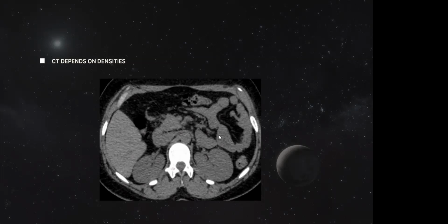Once a friend of mine asked, is CT better than MRI? The answer is CT is not better, CT is more feasible, it's more readily available, and in certain conditions, it does the job you need it to do. You don't need to go for an MRI to see any intraparenchymal hemorrhage when the patient has presented to you in the emergency and you really need to take an immediate decision about it. So what you do is go for a CT brain plain instead of going for an MRI. You don't need a very elaborate study in that case.